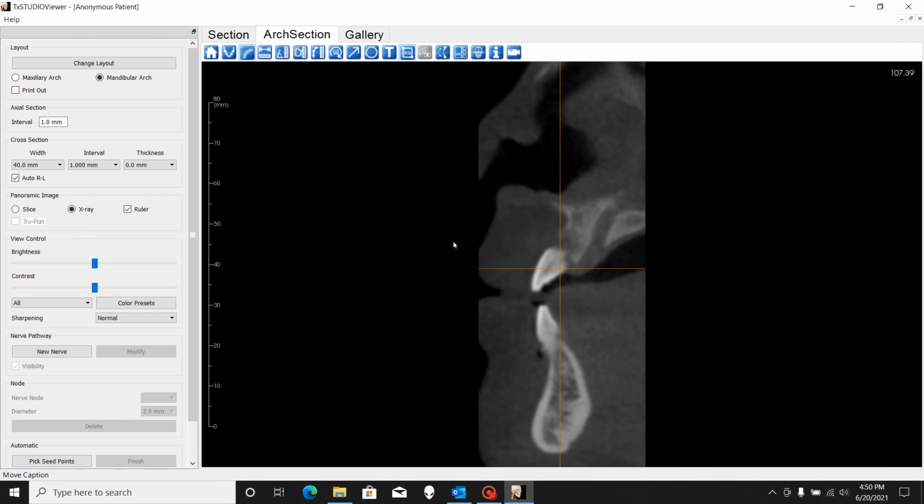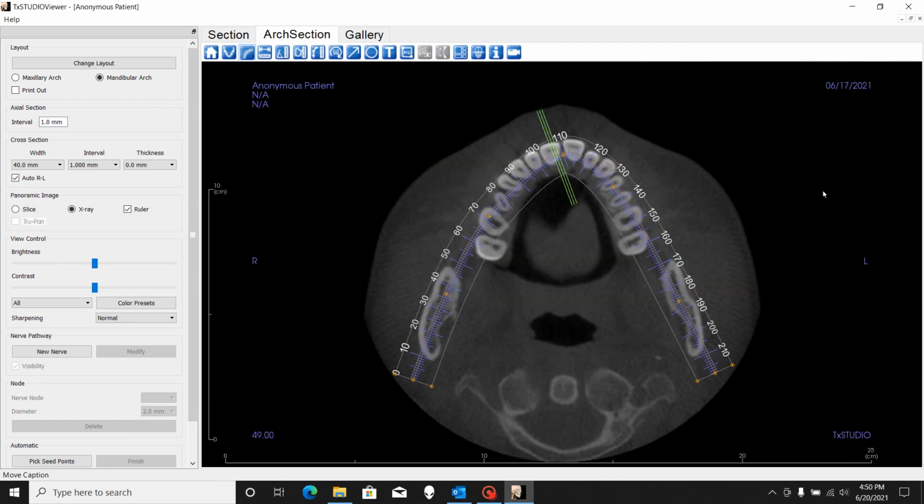Your Hounsfield measurement is here. If you click, you can use whatever type of shape you'd like. I'm just going to grab a quick circle, and if I say I want to measure the bone right in this area, let's take it back right about there. And that gives you your measurement. And just as anything else, you're going to click on it and delete it. Let's see. Your cross-section view, that will flip it, I do believe, when it's in the regular view.